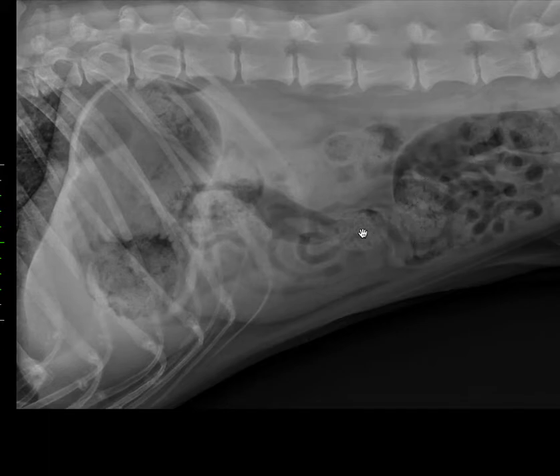So on the lateral view, I can tell that the colon is here, and again, there's a bit of superimposition. So overall, I'm okay with the colon and with the stomach, but I want to make the note that the stomach is a little bit distended and contains some granular ingesta. Now, the next thing that we're always interested in would be small intestine. I'm pointing to multiple small intestinal loops here. I'll put some arrows. All of these small intestinal loops that I'm seeing have some similar features.